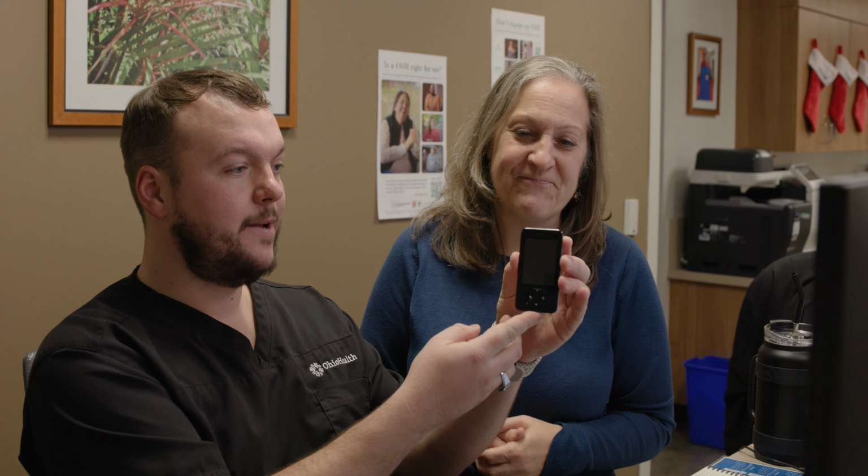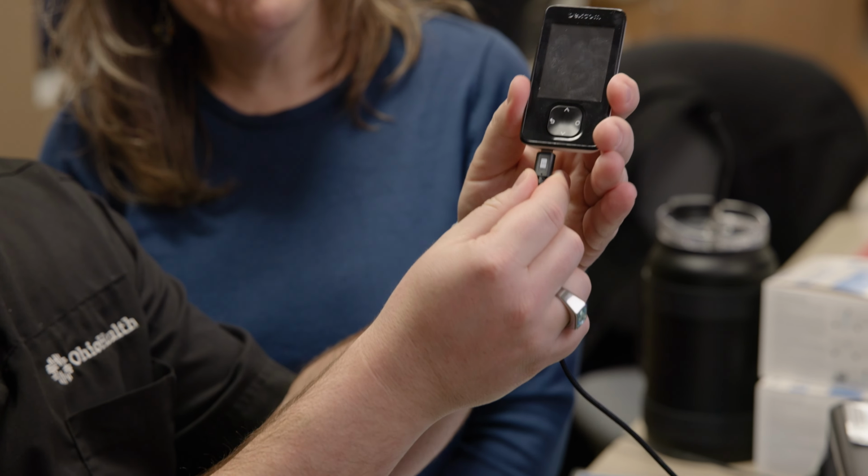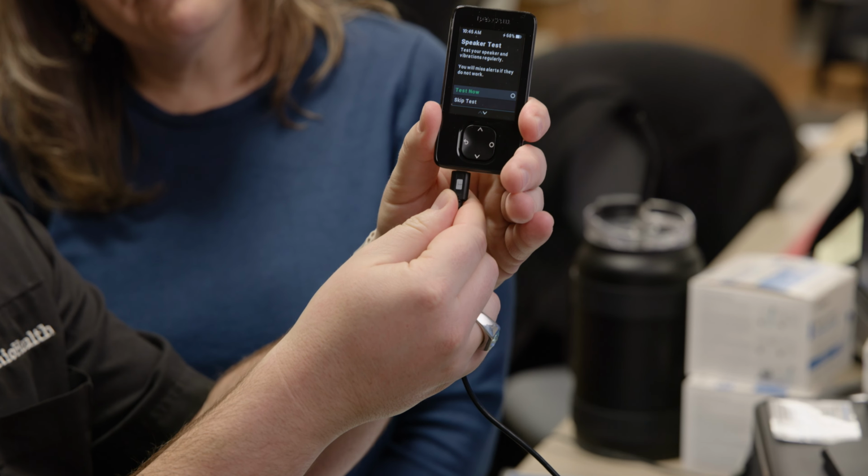All right. Are you ready? Yep, I'm ready. So I'm a patient coming in to the clinic today, and I have my CGM information. What do we do next? All right, so you're going to give me your Dexcom monitor today. And on the Dexcom, we're going to connect it to the computer. So when you come in, you have this cord attached already to your computer, to my desktop in the office. And this is uploading. What's happening with it now?